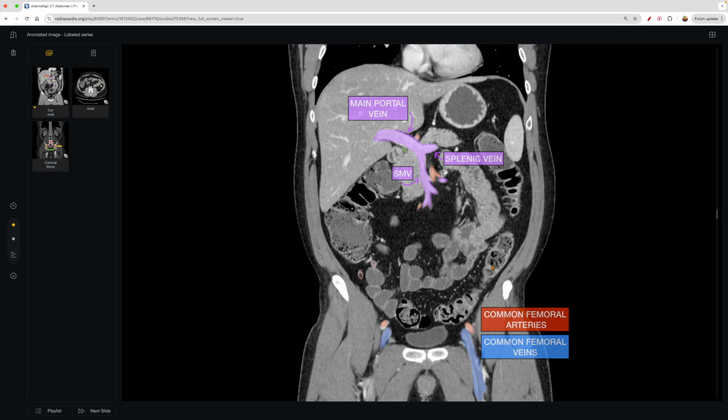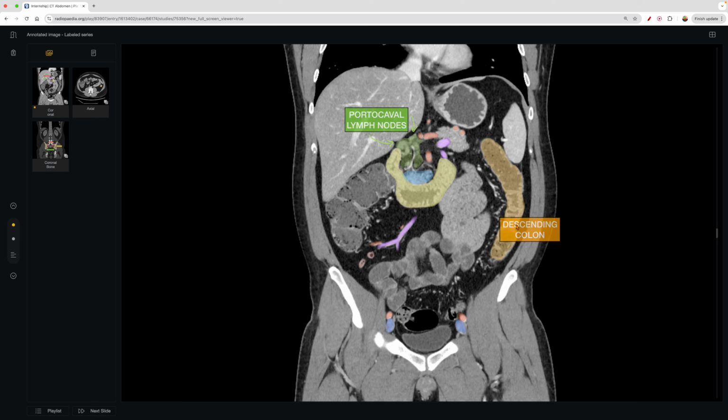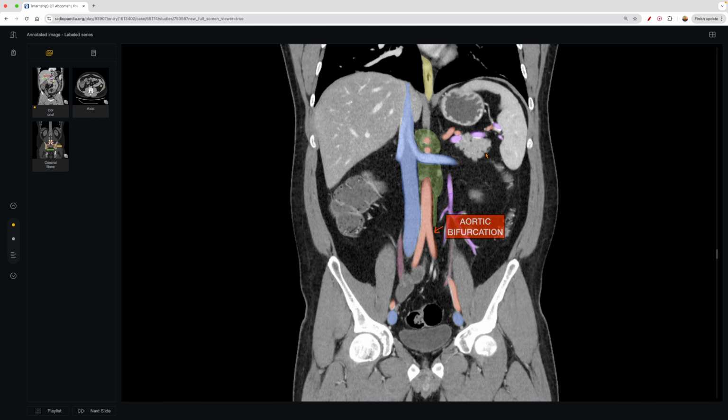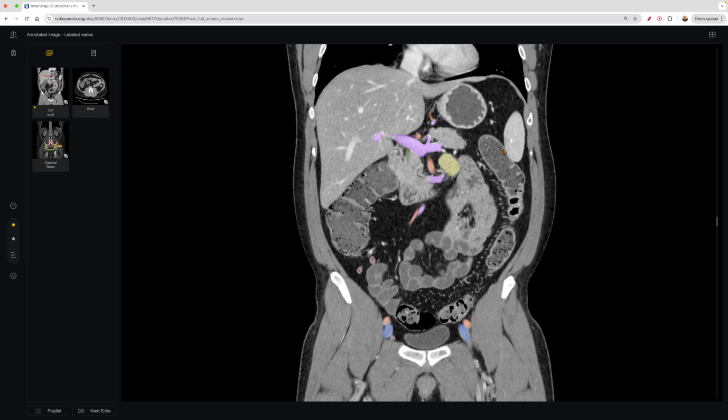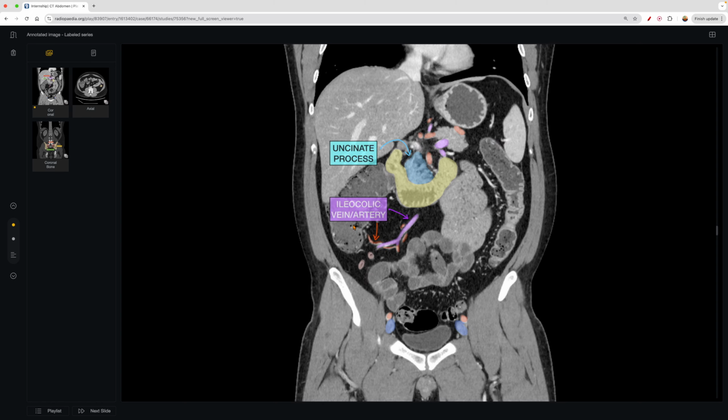And sometimes when it's too excessive, that's when you know it's an issue. So that goes the descending colon, and then it'll go from the transverse colon. And then you'll have to keep sliding around and just, you can visualize. I don't want to keep moving around and make you dizzy here. But let's look at the ascending colon here. And this is another important feature.